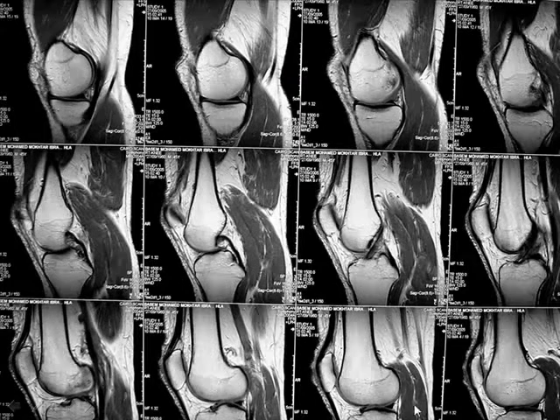In order to see the cruciate ligaments, you go first for the posterior one, the posterior cruciate, this one, which has a famous configuration. This is the posterior cruciate ligament. In order to see the anterior, you go an image here or there. You will find the anterior cruciate in one of these two images. Actually, you can see the anterior cruciate ligament in this image.